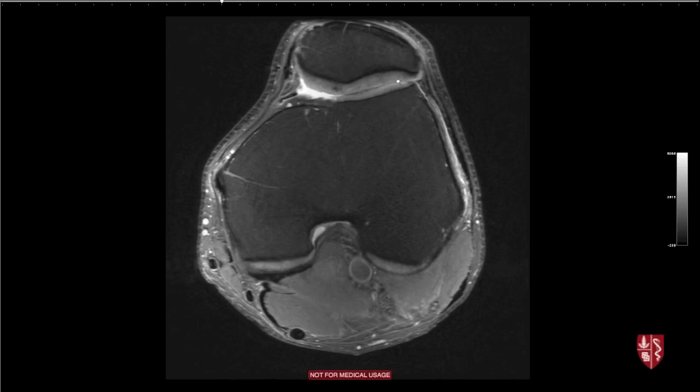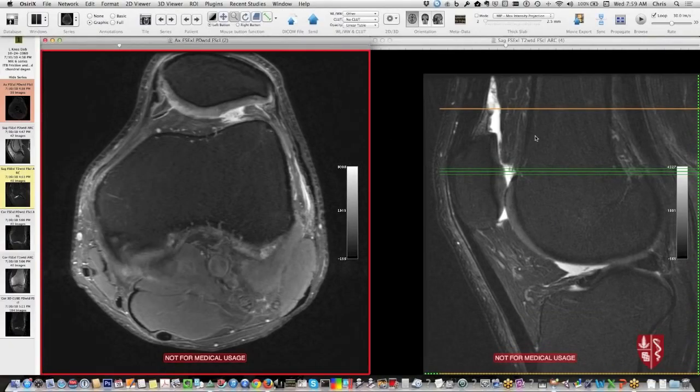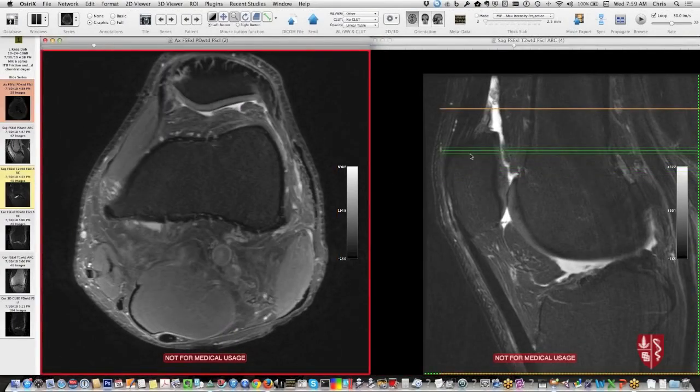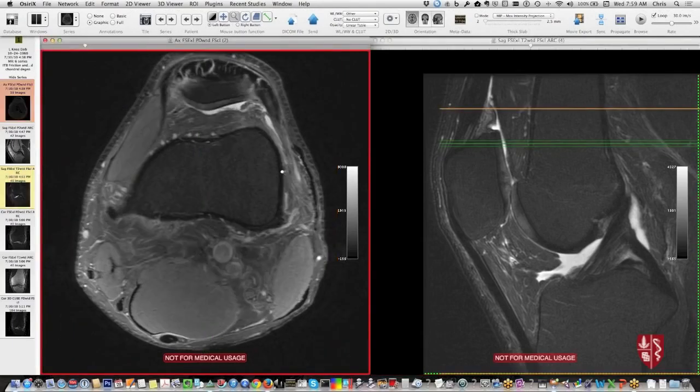It's important when you're on the axials looking at the patellofemoral cartilage not to get fooled by being too high. If I show it this way, the green line here references where the axial image is. Notice that if we're at this level on the axial image, what we're actually looking at is the upper part of the patella and some patellar cartilage, this stuff here. But then in front of the femur, it's not even cartilage yet. It's actually prefemoral fat, okay? And that fat's pretty low signal on fat suppressed.